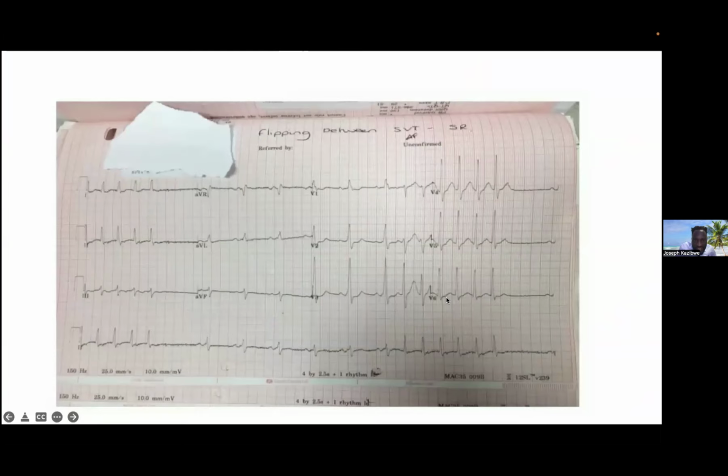So this is, again, somebody with an accessory pathway. What we are showing here, you can see a short PR, query delta wave. On this ECG, you can see one sinus beat, sinus beat, sinus beat. Then this one comes early, a PAC, as we talked about. We know it is coming from up because it's downward activation. It comes and sets off a narrow complex tachycardia. So we can see an example of somebody with an accessory pathway who is going into AV reentry tachycardia on this ECG.